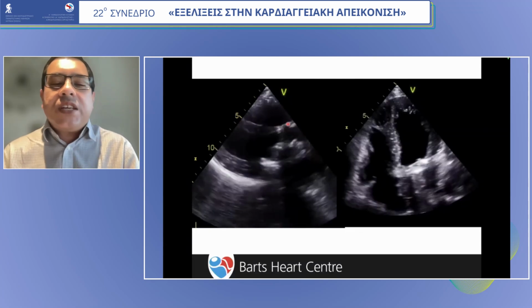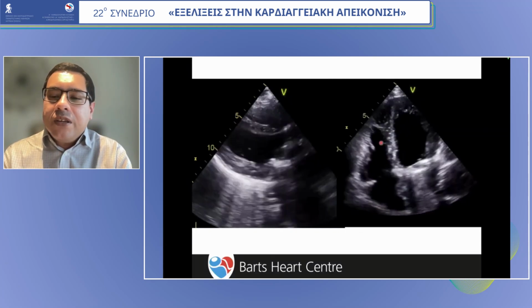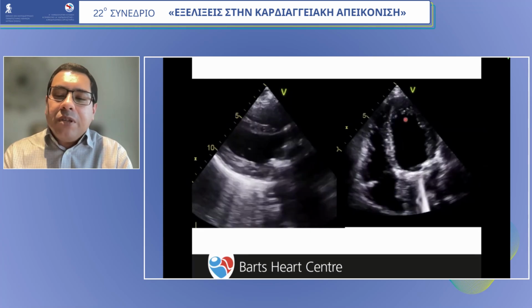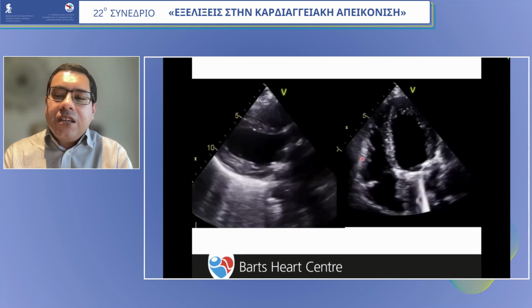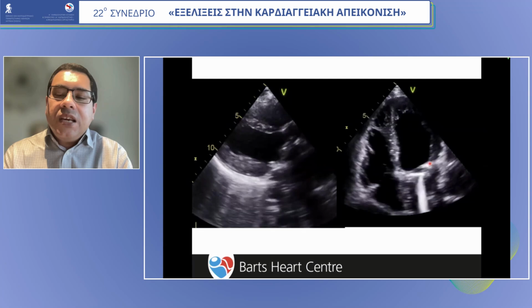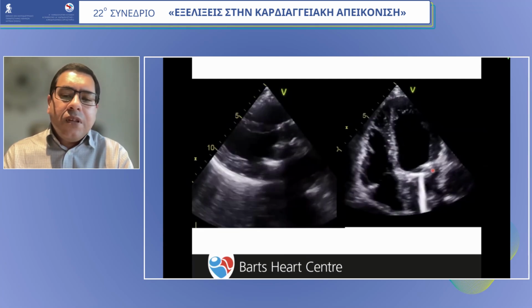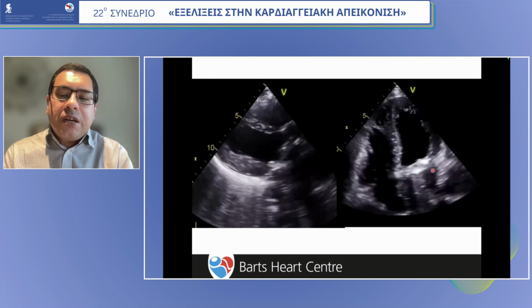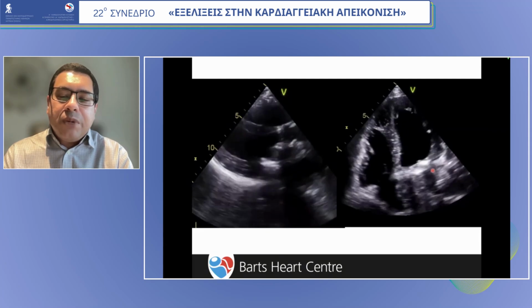This is their transthoracic echo. And the first thing you see from the transthoracic echo is, obviously they have LV impairment. The most striking feature is the RV is severely dilated, and the RV is dyskinetic. And as well as the RV being dyskinetic and dilated, we can't see any motion of the valve discs.